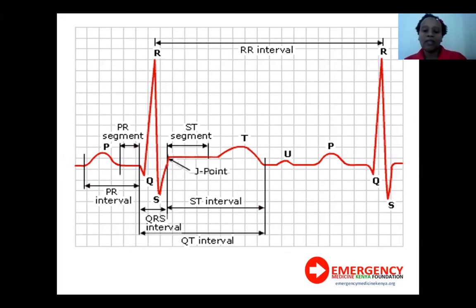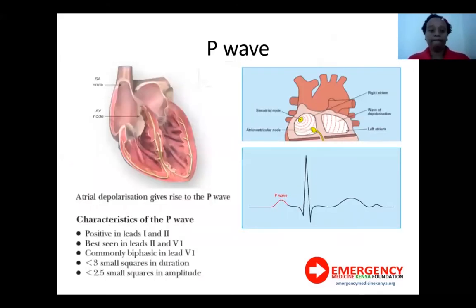You're able to know whether it's a normal ECG or it's an abnormal ECG. You do not want to take too much time on it. We had gone through that on the segments and what they also mean. So we go back to looking at the characteristics.